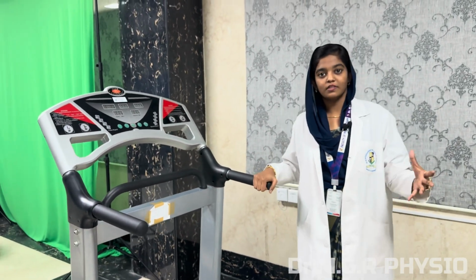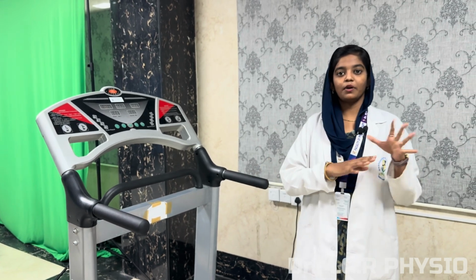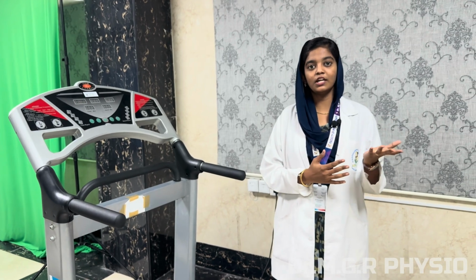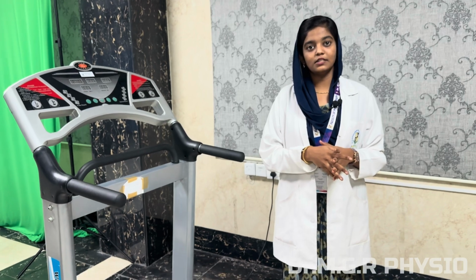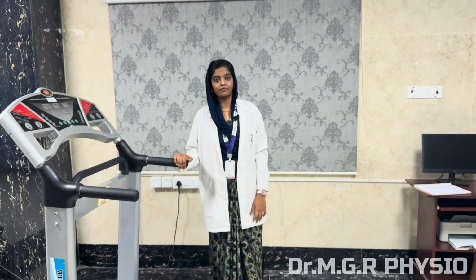Whole body vibrator is a machine that converts and sends mechanical vibrations into the body. Because of this, there are great effects on the body, increasing muscular strength, endurance and other fitness qualities in a person. It can also be used for various chronic conditions like multiple sclerosis, Parkinson's and fibromyalgia.